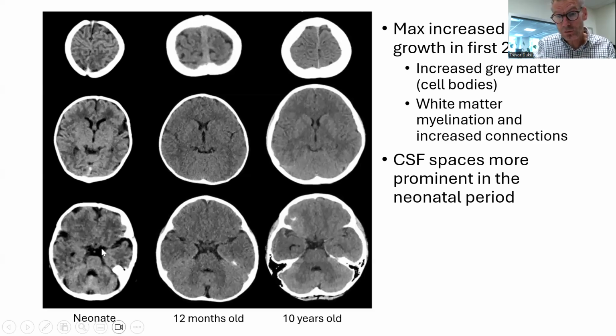It's not that their ventricles are under pressure or high. Often it is in TB, of course, but sometimes there's what we call ventriculomegaly ex vacuo, which just means that the brain itself is shrunk, so the ventricles are a little bit larger. That certainly occurs in children who've got malnutrition. The good news is that if you treat those conditions, if you treat their malnutrition, if you get them catch-up growth and their body grows, then their brain can grow.